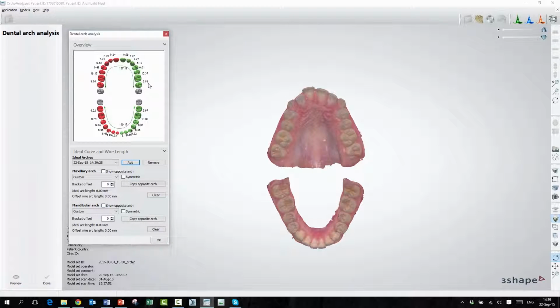Alright, so you get that for free, basically. Yeah, exactly. But if you haven't segmented your teeth, there will be no numbers. And we obviously have a separate video on teeth segmentation, so please check that out. And this number here is all the teeth added together. So this is the arch wire added together with these teeth. Yes. Good.